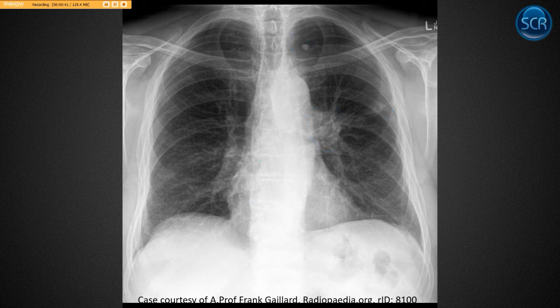It's not really DISH. We can look here and see claw osteophytes, and they form on the right more so than the left, just like DISH does, for the same reason, because of the inhibitory pulsations of the aorta. The aorta is a little tortuous here. We see that with advancing age. The aorta becomes weak just like their skin does, and it can become a little bit tortuous. No big deal.